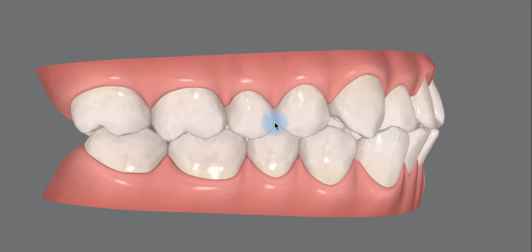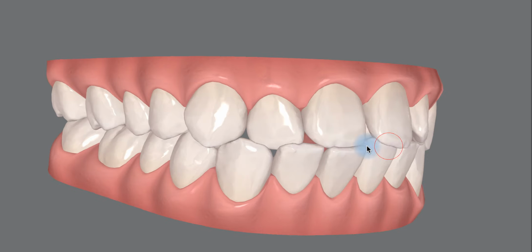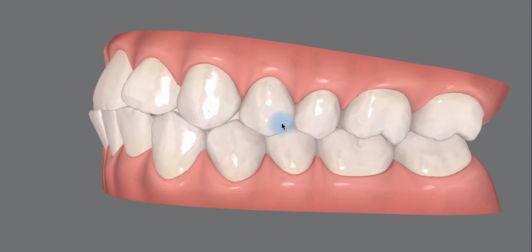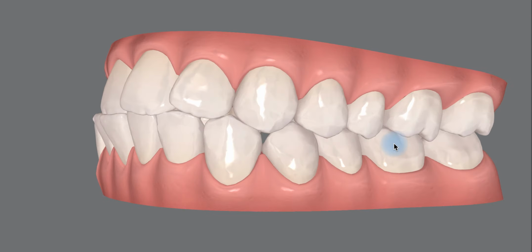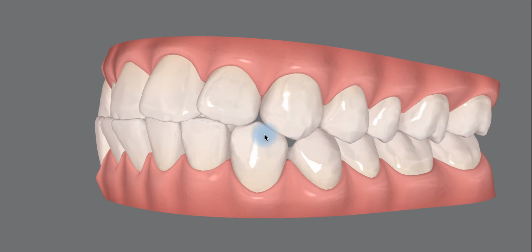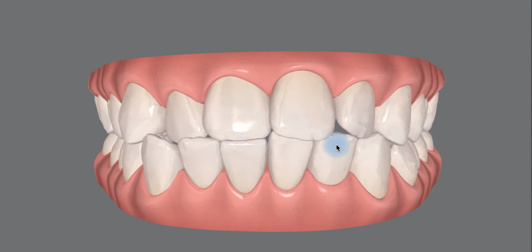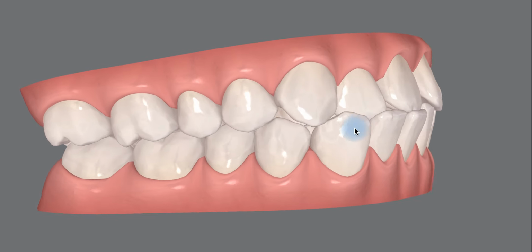So this patient is skeletally class 3. Left side, probably a little bit more normal on the canine. The molars are class 1. Yeah, still class 3 on the canines. There's probably a Bolton discrepancy here. Let's take a look at what that would be. Yeah, the Bolton is not bad. It's outside the view of the screen, but it's 0.5 mandibular excess. So it's not a severe tooth size discrepancy. It's more of a skeletal discrepancy.